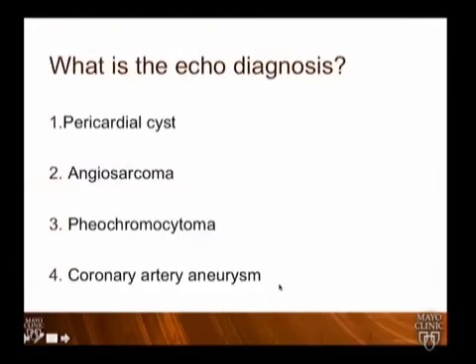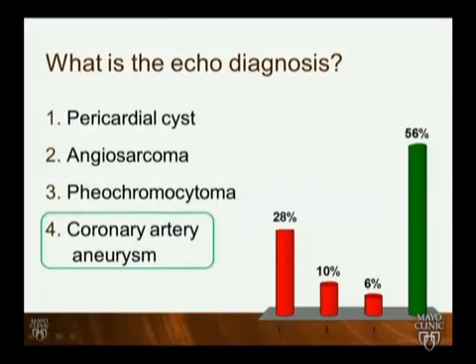So, do you think this is a pericardial cyst? Is it an angiosarcoma, pheochromocytoma, or a coronary artery aneurysm? Okay, so over half got coronary artery aneurysm. So it's kind of a tricky one.